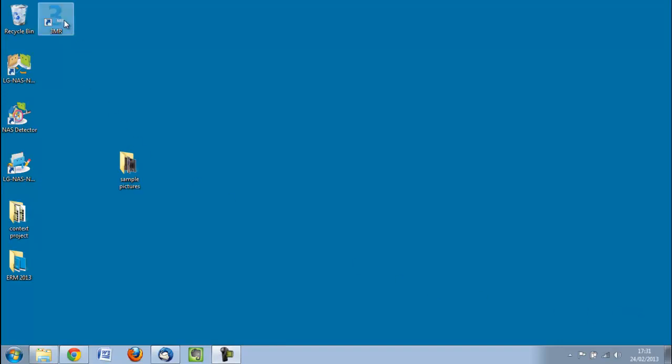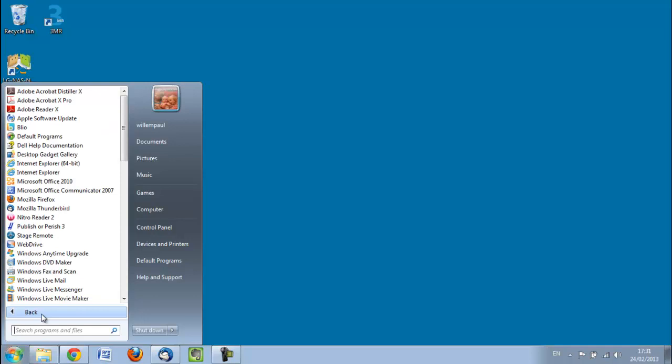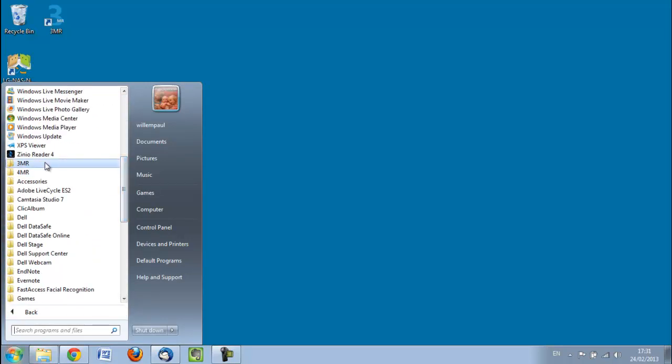Okay, to start the application, I click on the icon, or I could start it by looking it up. It should be like 3MR. Here, this one.